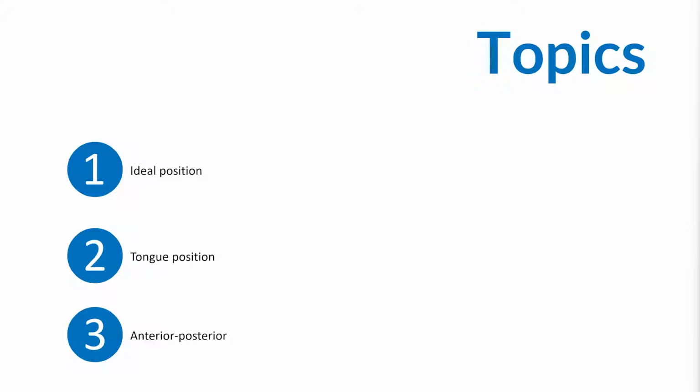In section 3, we'll learn about the anterior-posterior error. This is also a common error. We just reviewed that some studies have shown 6 out of 10 panoramic radiographs may show such an error. Then we'll talk about lateral or head rotation errors. The patient's head is rotated towards the right or towards the left.